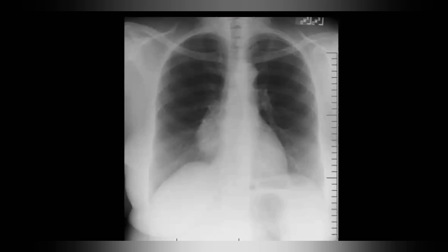So I've been presented with a chest X-ray frontal projection of a slightly mature patient. I can see soft tissue density opacity in the right paracardiac region, which does not appear to be silhouetting the right heart border. So, are you sure? Where's the right heart? I can't see it. This is very clear left heart border. Yeah. You see a clear right heart border? I'm actually suspicious because it's not very clear, but it's also okay.